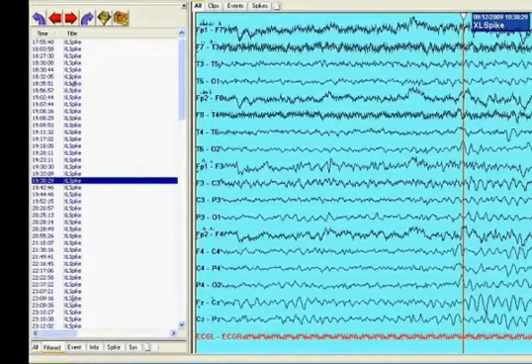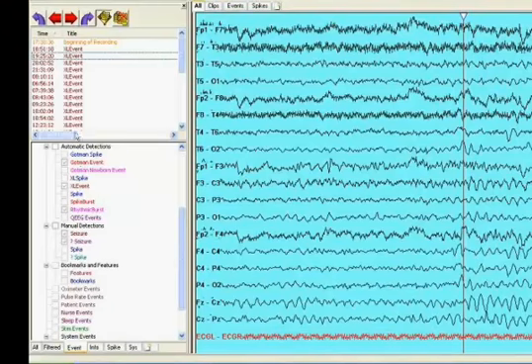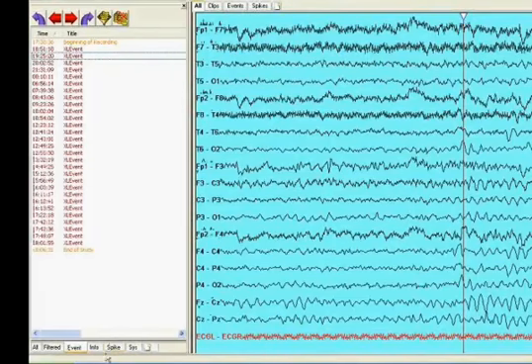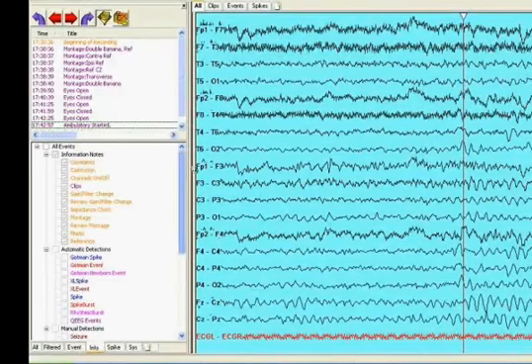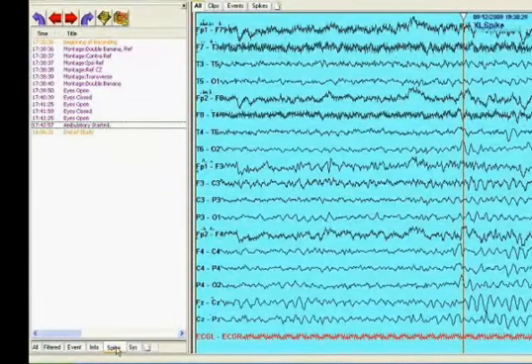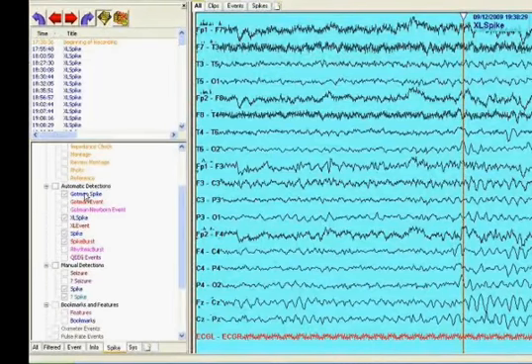Now, you can save these configured filters by using the additional tabs at the bottom here. So by default, the software includes an event tab, which is basically a pre-configured filter that is designed to display any type of event as checked off in the filter configuration box here. All right, so if you click on Info, Info is configured to display annotations from this particular category. And if you click on the Spike tab, this is designed to display events that are considered spikes.